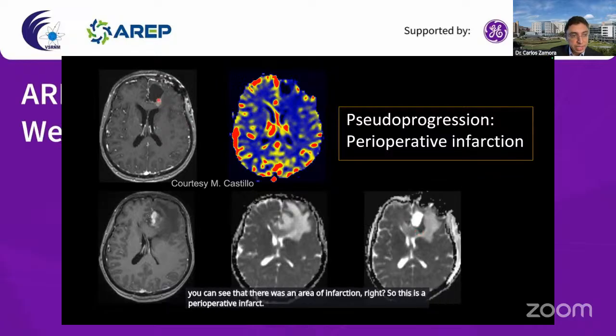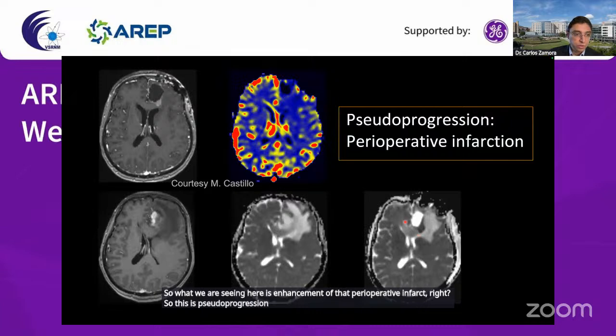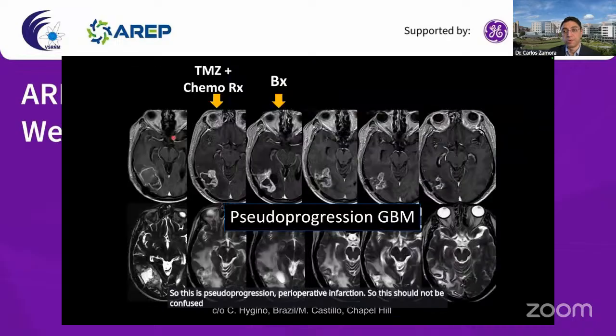So what we are seeing here is enhancement of that perioperative infarct, right? So this is pseudoprogression, perioperative infarction. So this should not be confused with true progression. Right? That's a case of pseudoprogression.